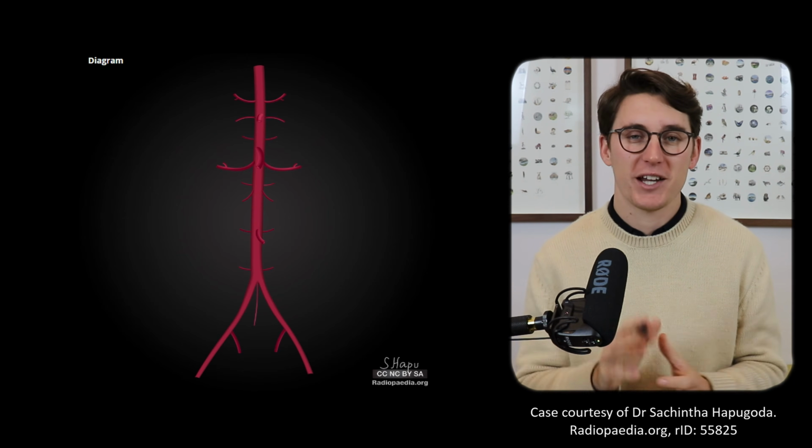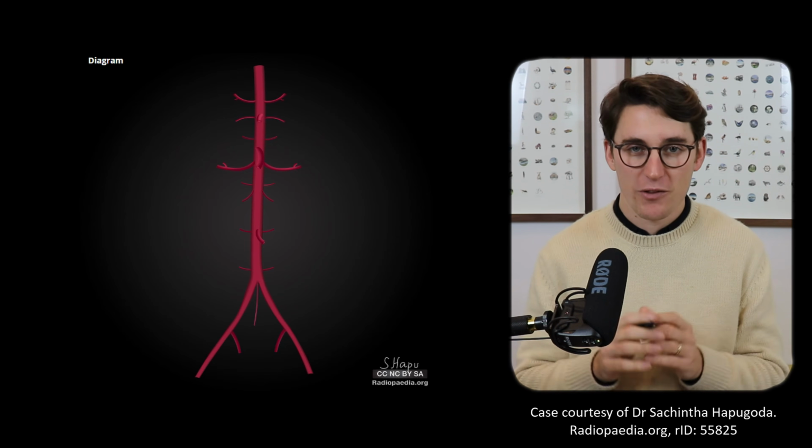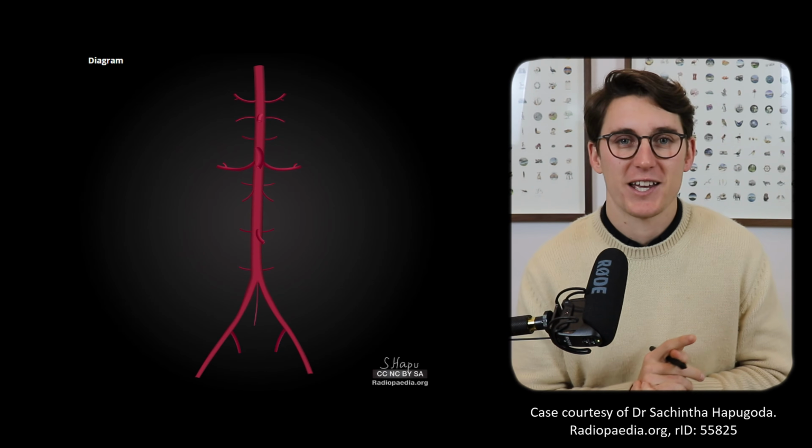I'm going to take each of the major branches one by one, and we're going to take our time through it and go through systematically the various branches off of those branches and then follow those arteries all the way down to the end organs.